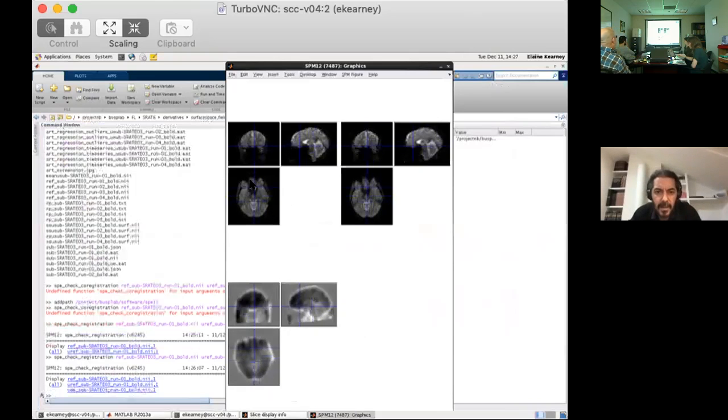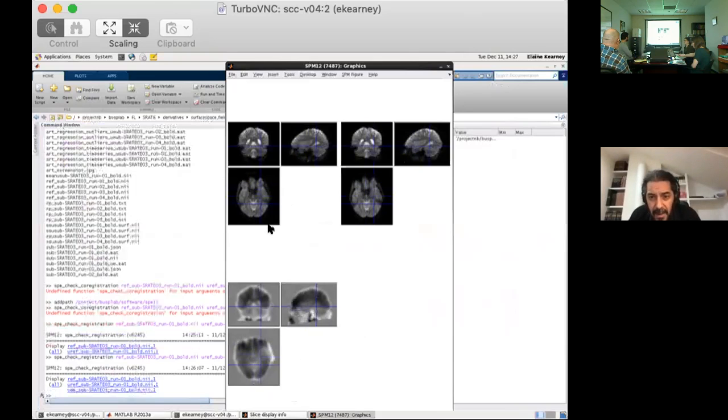So I guess this looks dark where you would expect the most warping, and bright where you might. I also cannot tell. In some places it does look better, but yeah, I'm not entirely sure about this.